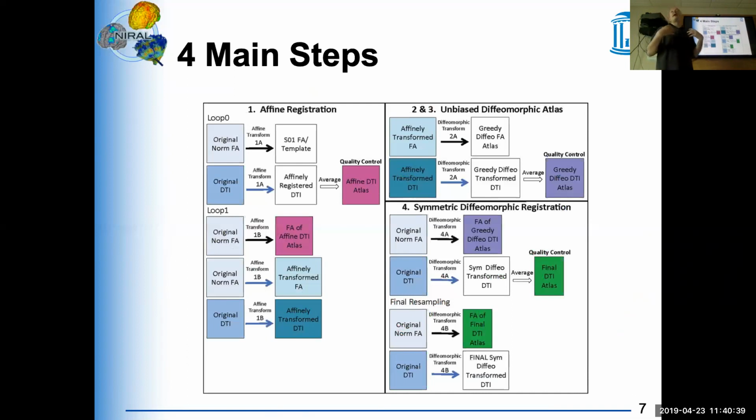And that actually is what ANTs atlas building does. It basically does this step. In what we usually do, we run this step, which is this final diffeomorphic atlas, twice. If you do that with ANTs atlas building, this is done until it converges, which means many, many times. So I'm going to now go through each of these steps a little bit more in detail.